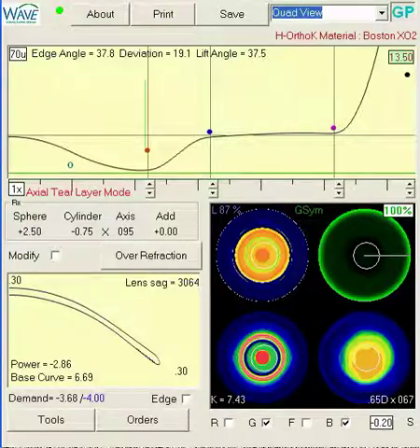This is a hyperopic ortho K case where the patient's worn lenses for a few nights but not getting a whole lot of treatment. And I would say that patient probably needs a little bit more time, but I think we can make some lens changes too to kind of accelerate the process. Hyperopic ortho K is kind of new and everyone has their own design philosophies, and I think to an extent everyone is right and to an extent everyone is also wrong. We just don't know exactly what we're doing.